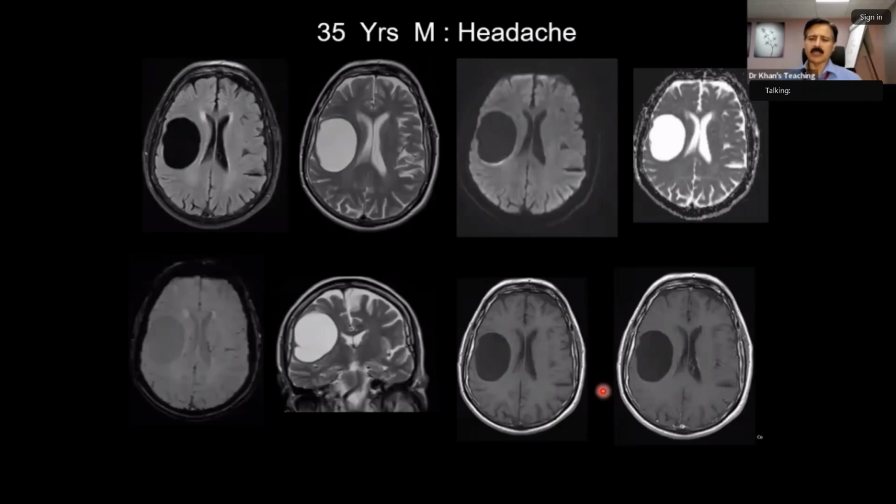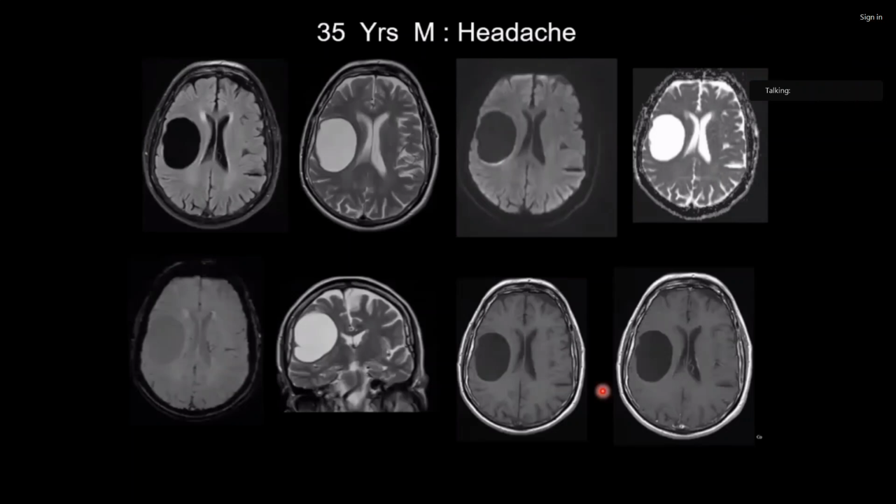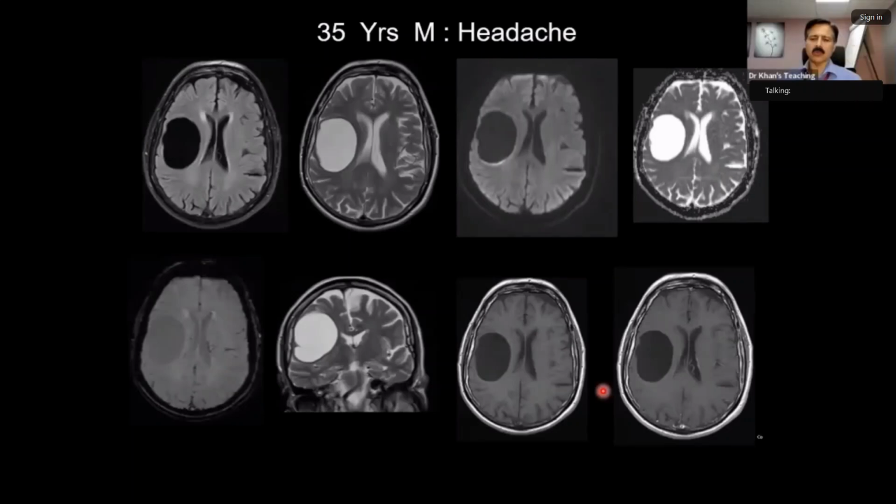You can have various kinds of radiology, and according to the type of hydatid, various types will have slightly different radiology. Please remember the classical daughter cyst appearance or membranes. If you go back to the histology, it has got 3 layers, and if the layer becomes crumbled inside, you will get those membranes. There can be daughter cysts also, just like you can have daughter cysts in the liver or the lung. But classical hydatid, which will come in the exam, is like this.